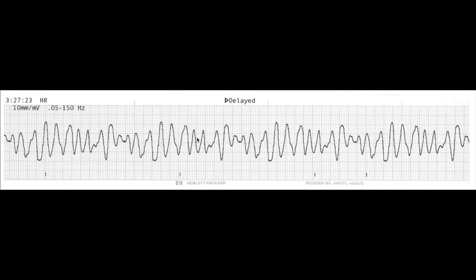Here is an example of torsades and what it looks like. So we can see here it starts off quite slow, gets bigger, smaller again, bigger. So it has this kind of wavy pattern to it. So this will always be torsades, not VT or VF, just torsades.